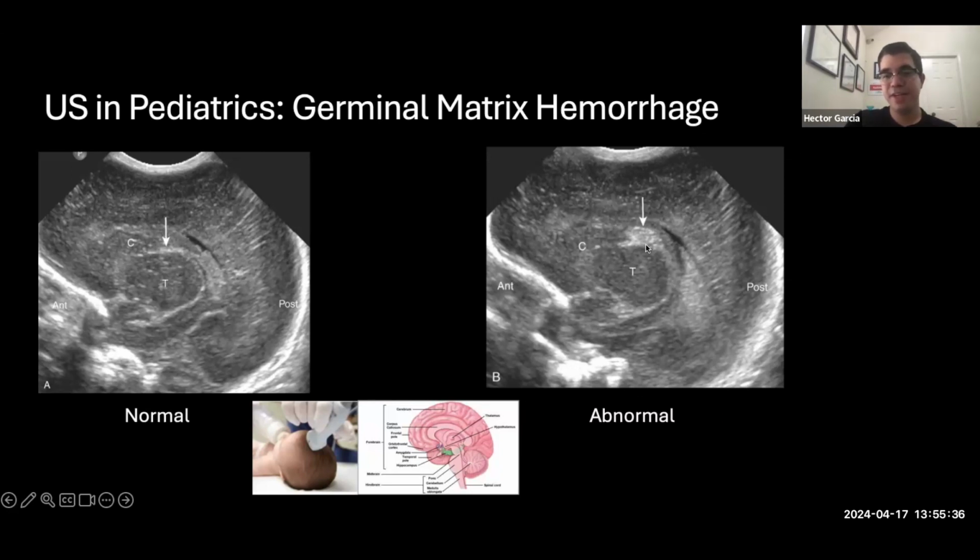The reason we can see inside the head in ultrasound is because the baby's brain hasn't calcified yet, and the fontanelle allows a window into the brain, as we can see in this image. The echoes go through the fontanelle and come back, and we can get a glance into the baby's brain without using ionizing radiation.